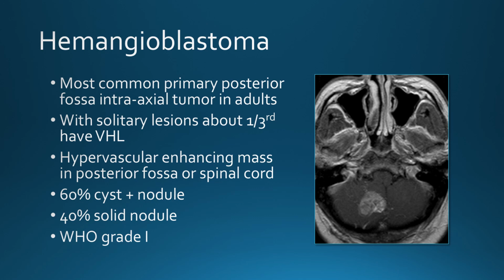It's a hypervascular enhancing mass. The classic appearance, about 60% are a cyst with an enhancing nodule. The other 40%, like this case, are just a solid enhancing nodule, and these are WHO grade 1.